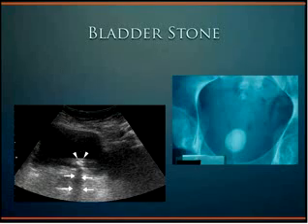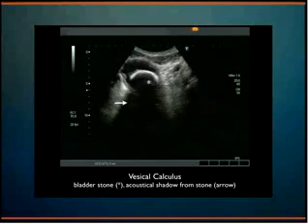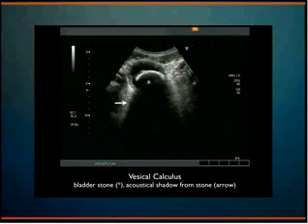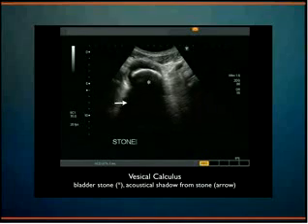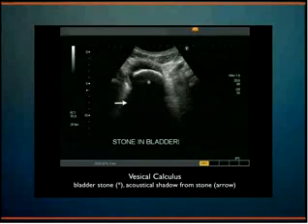This 77-year-old female from a nursing home came in with abdominal bloating. Plain films were taken with concern for constipation, and this mass was seen in her pelvis. The ultrasound on the left depicts the bladder stone with prominent shadowing. This is a 69-year-old, otherwise healthy female who had urinary urgency for 6 months. You can see within the lumen of the bladder there is an echogenic calculus which represents a bladder stone. There's acoustical shadowing seen posteriorly from the stone.